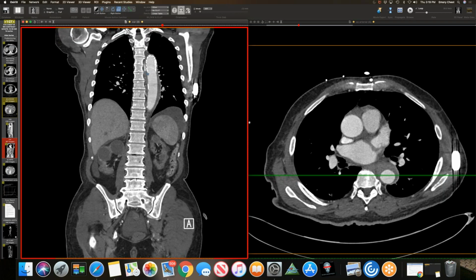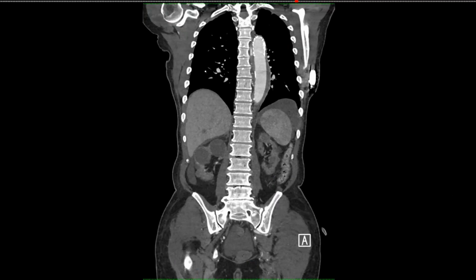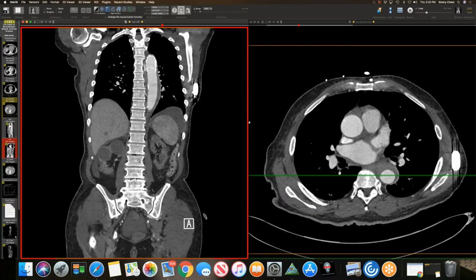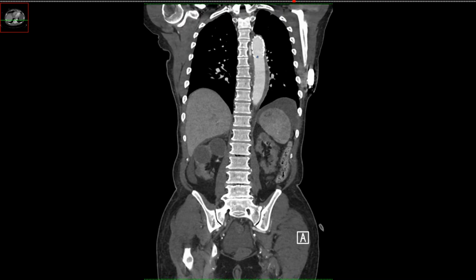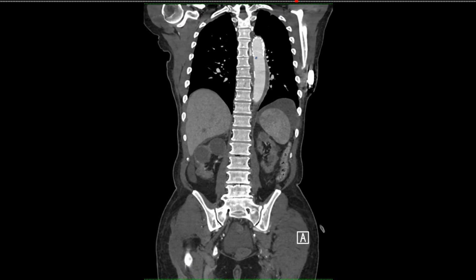Peter, can you just double click on that to zoom in, show it by itself, the one on the left? Yeah. Oh, the one. Yeah. And then just use Command S to zoom in, and let's see if we can trace that. If you just use Command S to zoom in on your keyboard, make it big, it should mag up, or use a zoom function.